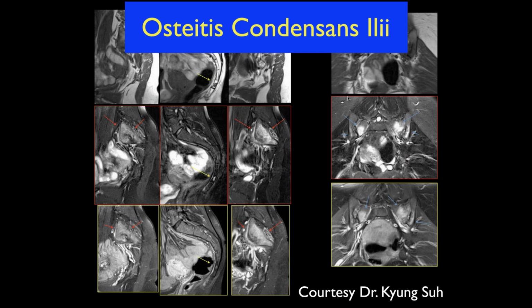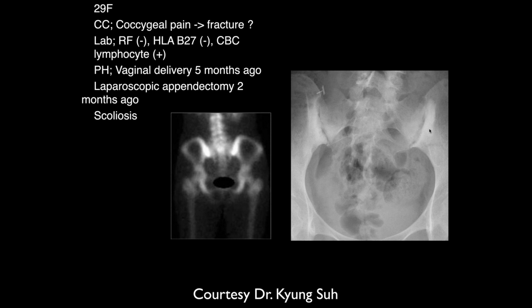Yeah. It's a woman, and it's only on the lateral side of the joint. So it should be bilateral, shouldn't it? On either side, both sides of the joint. Well, the edema is both on the sacral as well as the iliac side here. Right. On the plain films, we could see the sclerosis was probably on both sides as well, though it was mostly on the iliac side.